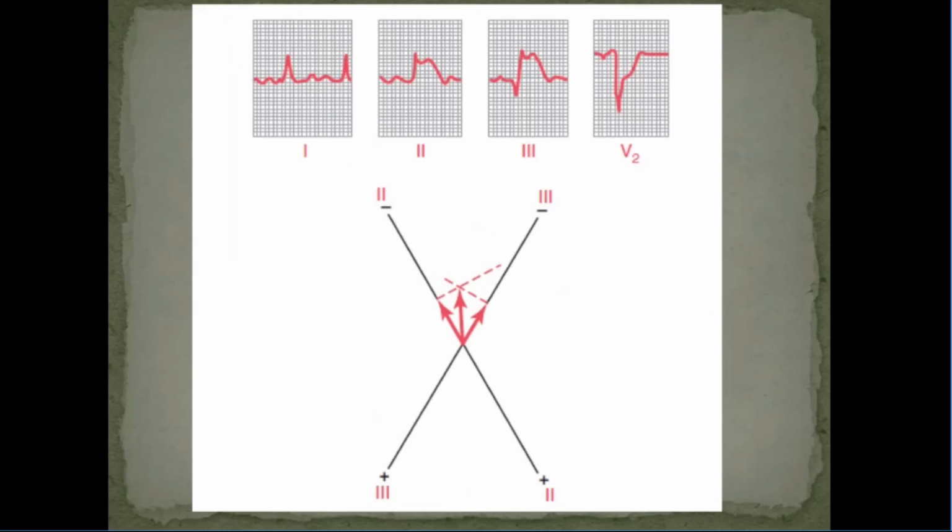So let us analyze this ECG for myocardial infarction. First of all, I'll find out the J point and draw an isoelectric line in each lead. As you can see here in lead 1, there are no significant changes of myocardial infarction present. Whereas in the case of lead 2 and lead 3, changes are seen clearly. So we are going to plot the injury vectors in lead 2 and lead 3. As you can see, both are negative vectors. Let us find out the resultant vector.